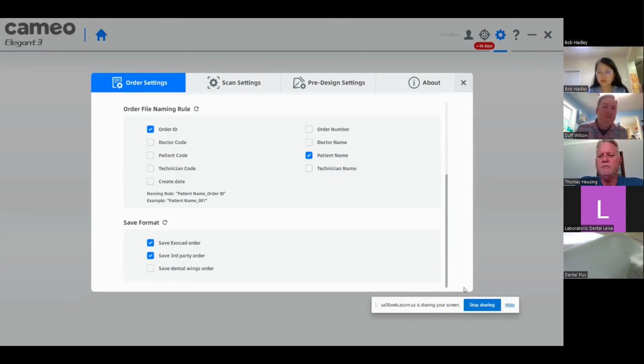I will say, one of my doctors had this great idea, and I was going to present it to my friends at Adite. I think there needs to be a number on the tips, or we can engrave a number ourselves. But the system comes in a nice James Bond briefcase here, and there's paperwork in the briefcase. But I think there needs to be a laminated sheet that has numbers 1 through 5 in there and 100 squares below them. And then they can take a dry eraser and mark every time they autoclave tip number 1. And that way they can keep count.